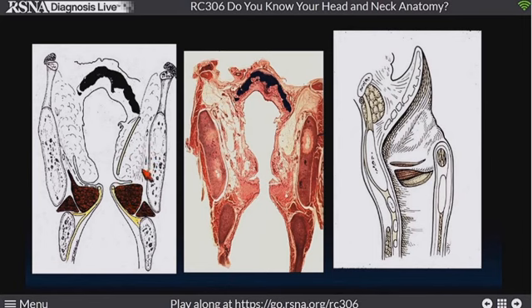And as I said, the paraglottic space is one of the most important routes of spread for us to look at because there's no way that they can really pick it up by just looking into the larynx. So in the histology, here is the thyroarytenoid muscle. So fat to muscle transition tells us where the ventricle is. And then when the muscle disappears, you can think of this as being glottis and subglottic.